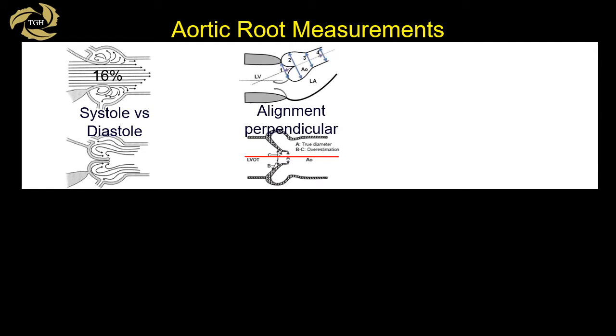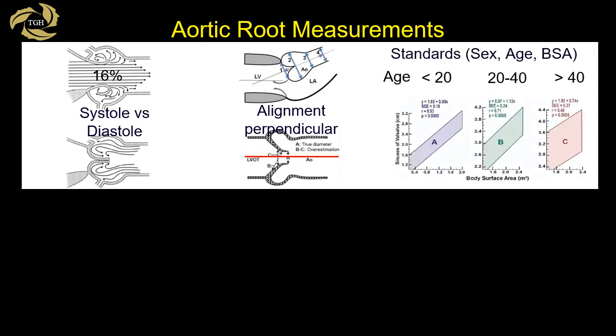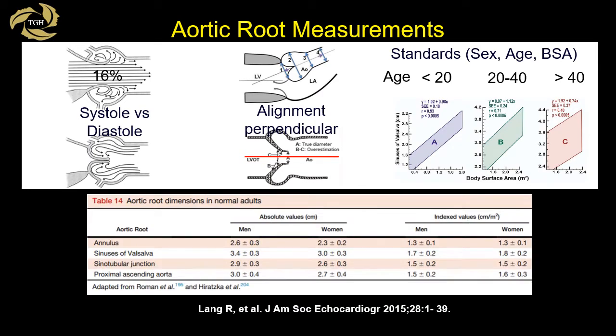It is important to have as symmetrical alignment as possible and optimal gain. A high gain thickens the aortic walls. There is some variation in body size and age, and root measurements as shown in the Framingham transthoracic data. However, most follow the absolute measurements as mentioned in the guidelines.